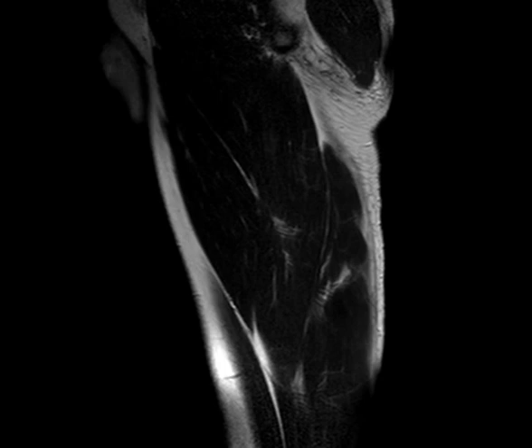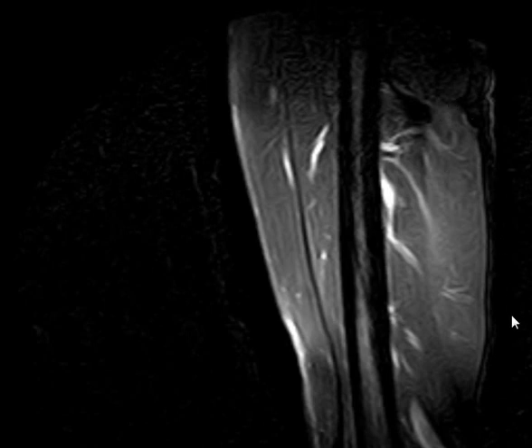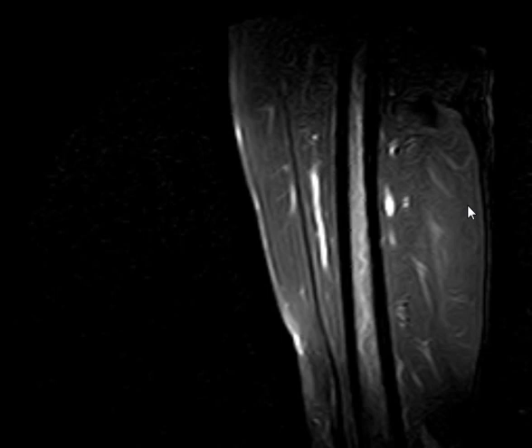Second question, what muscle is that? I need you to tell me the name of this muscle. It's just basic anatomy, not beyond your level. The best way to identify anatomy in this case is to see it on axial images. You will never understand anything on coronal or sagittal.